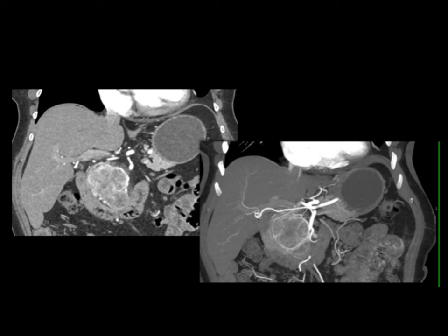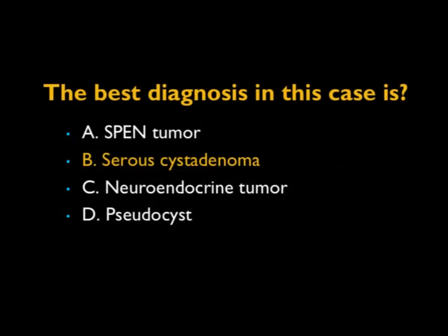But in this lesion, well-defined, sharply marginated rim enhancement, you've got to be thinking about serous cystadenoma. Serous cystadenoma indeed is not an uncommon tumor, and it also has many different variations. The classic cystic lesion without any vascularity at the edge, with dense central calcifications, does occur, but this is one of the more common variants for serous cystadenoma, an important differential diagnosis.